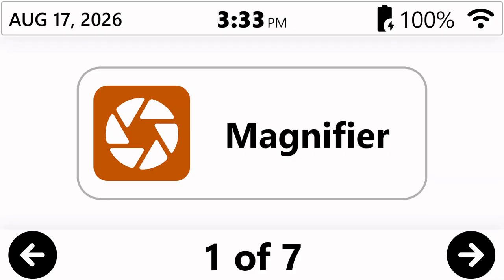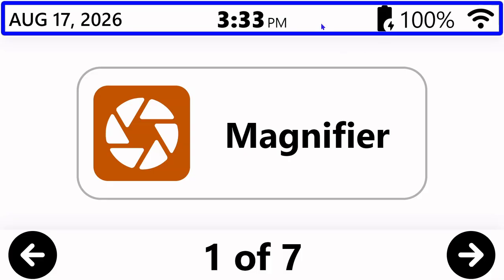This is Roger, Low Vision Product Manager here at HumanWare. In this video, I will demonstrate for you the new annotation tools that have been added in version 1.7 of the Prodigi software. And this specific video is going to focus on using them within the Files application.